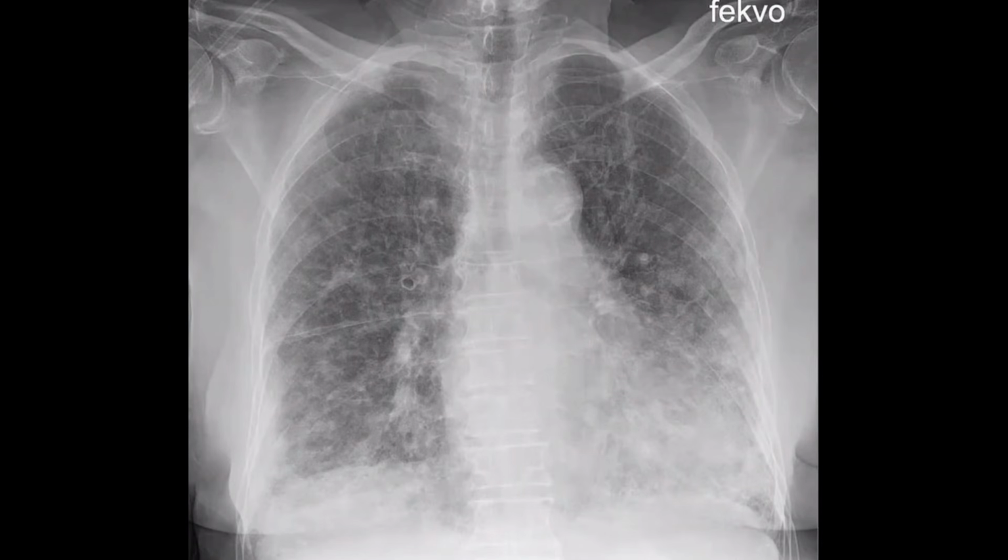Yes, sir. This is a frontal chest radiograph of a skeletally mature patient in which I can appreciate reticulonodular shadowing in bilateral lung fields, more pronounced in the basal region. There is also blunting of the right CP angle with loculated laminated pleural effusion along the lateral chest wall. There is also thickening of the fissures. Next, I would like to know the age and history of the patient. The patient is 55 years old and complaining of acute dyspnea.